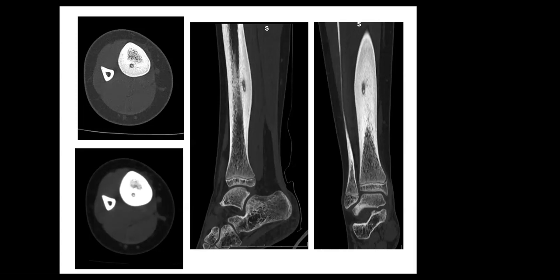Yeah, so bone scan is not really a reliable test to differentiate between osteoid osteoma versus Brodie's abscess, because both of them will show increased uptake. Maybe you see the donut sign on Brodie's abscess, but really very subtle. The best test to differentiate between Brodie's abscess and osteoid osteoma is actually dynamic MRI, which I don't have here on this patient.